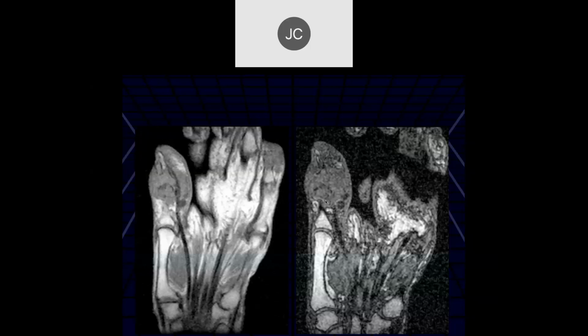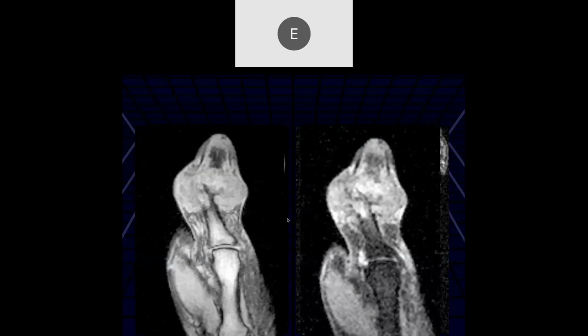Elior, what do you think of this case? Again, we see bone destruction involving that first IP joint, soft tissue thickening. Yeah, be concerned for gout again. And then here we can see that there's marked thickening, kind of a spiculated portion here, but we can see there's marked instability here, really a completely discombobulated joint.